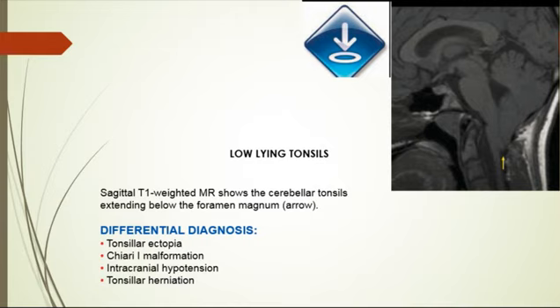In intracranial hypotension, what's called CSF hypovolemia, there is downward sagging of the entire brain, including the tonsils. Associated findings include venous engorgement, brainstem and pituitary edema, like we saw in the previous case, okay? Also subdural effusion. Intracranial hypertension causes crowding of the intracranial structures, which in severe cases can lead to tonsillar herniation.